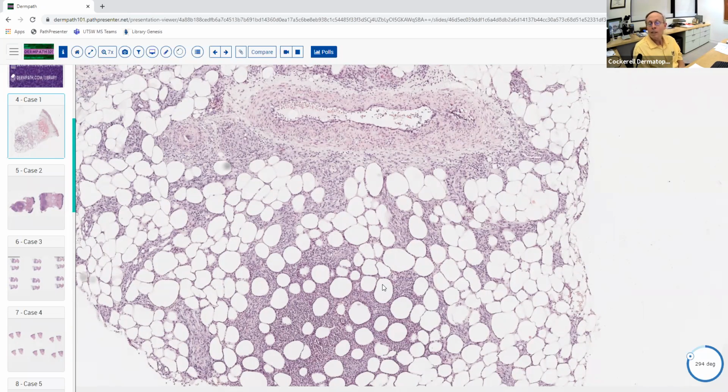And we see this, the textbooks, all the classic teaching is it's associated with AFB or mycobacteria, MTB. But actually, we see this same pattern in erythema nodosum leprosum. It doesn't look like erythema nodosum histologically, it looks more like this histologically. And in certain other infections that can sometimes be associated with panniculitis, it can give you this pattern.